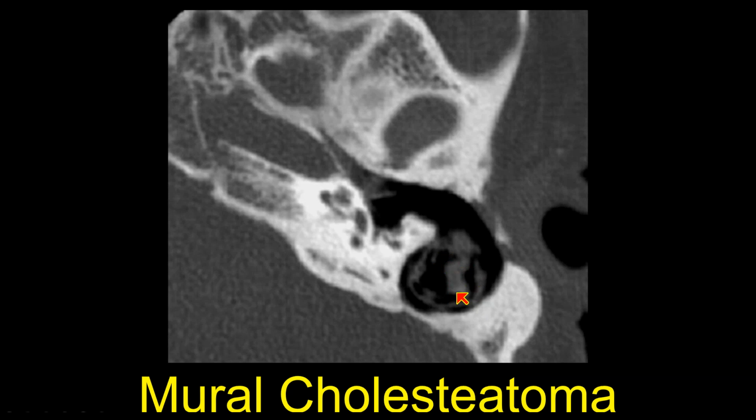So there was skin in the wrong place in the mastoid air cells, and it continued to enlarge over time until it broke into the external auditory canal. And essentially, the cholesteatoma did an automastoidectomy on itself, but there is a rind of cholesteatoma left behind. But I was completely misled because I didn't have that surgical information. I thought this was a postoperative case.